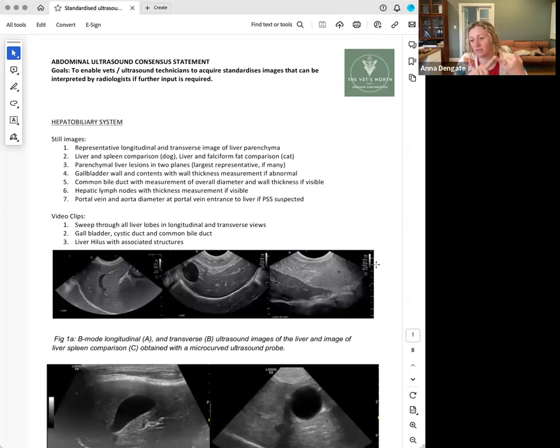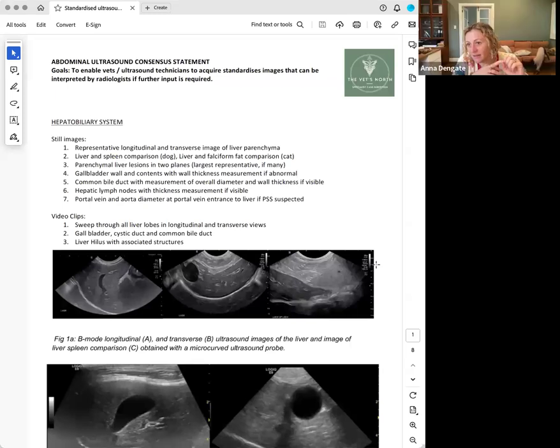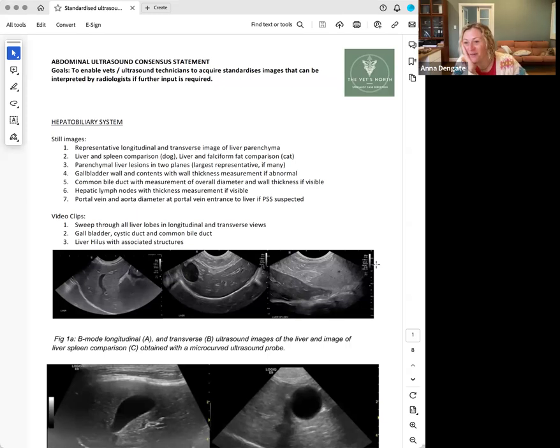Obviously, congestion is increased fluid. What echogenicity is the liver going to be if you're congested? Hypoechoic. Hypoechoic, did you say? It should be, but it's bright. I don't know why. But congested livers are usually hyperechoic, with a quite smooth echo texture.